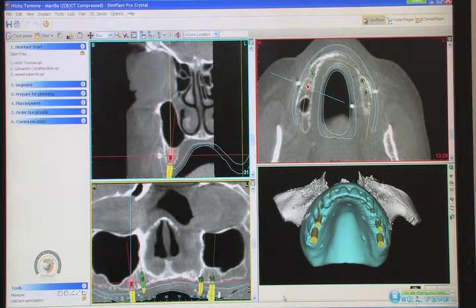We've received your scan of your patient, and we've segmented it, and we're ready to review the case. It may turn out a little different from your original RX, based on how the patient presents. Right. So just to review the different views we have here for our audience, I'll go quickly.